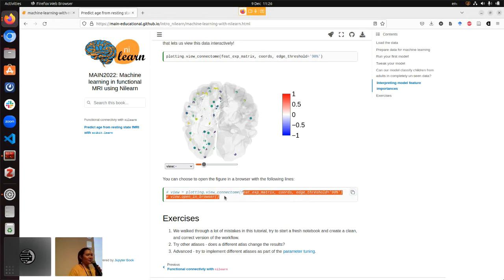So that concludes this part of the tutorial. There's a lot to cover because we're trying to cover some basic machine learning and some other information like scikit-learn interfaces. So there's quite a lot in this notebook. One of the exercises I will give you is how to pull out the code from this notebook and compile just one correct version to run this pipeline.